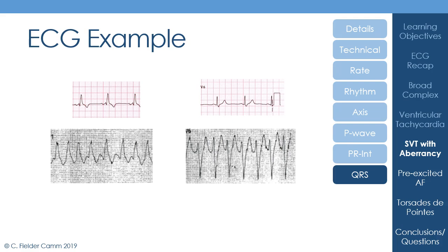If you look here, these are the same ECG leads that I showed you when we were talking about bundle branch block, and you can see that you've got this monophasic R wave in V1 in this current tracing. If you remember, we said you had to have this RSR prime pattern in right bundle branch block, so we don't have that. And you've got this large, deep S wave that you don't see in right bundle branch block. If you remember, in right bundle branch block, you see that relatively small but slurred, wide S wave. And so although it might look like an M and a W, it's very different from right bundle branch block.